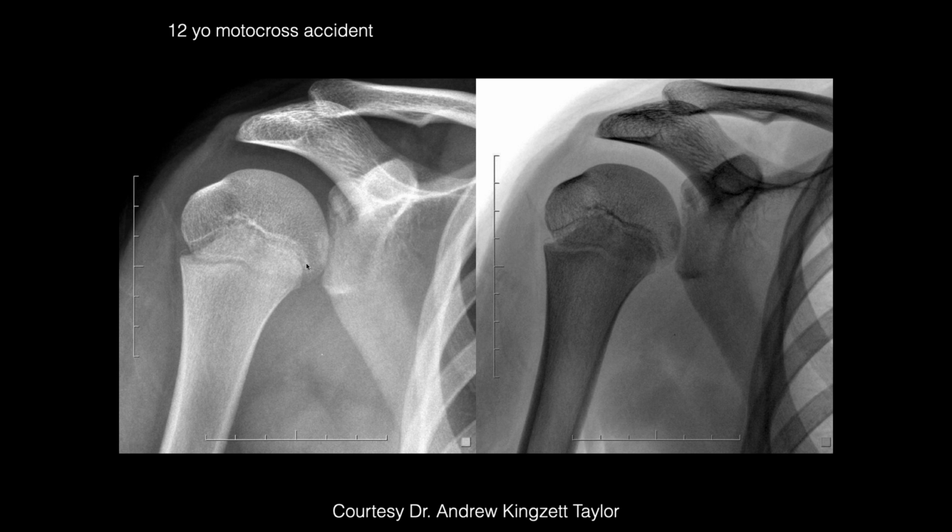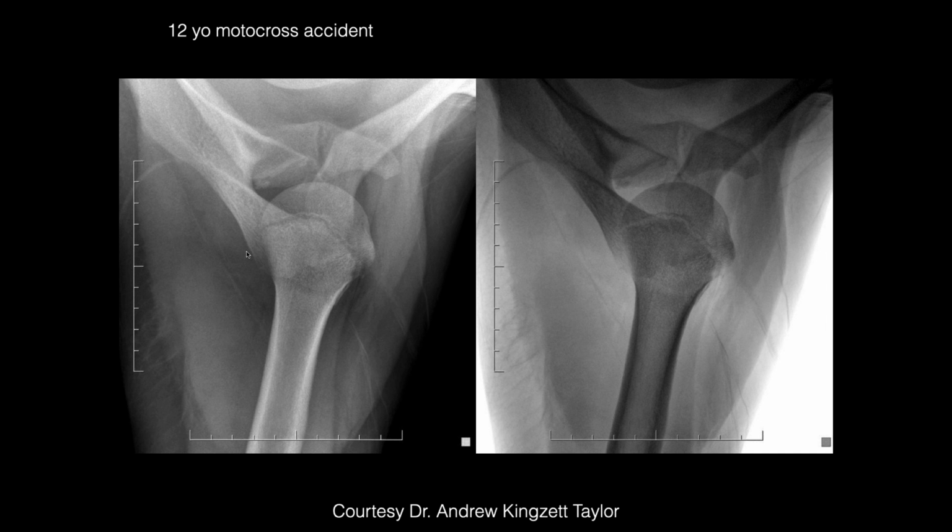So the x-rays here, I wouldn't say. I think on the x-ray, John, what do you think that is? What are you referring to, John? The glenoid, the lateral aspect, or posterior aspect of the glenoid. Are you talking about back here? Yeah, is that a growth something? I don't think so. But I would be a little concerned on the plain films.